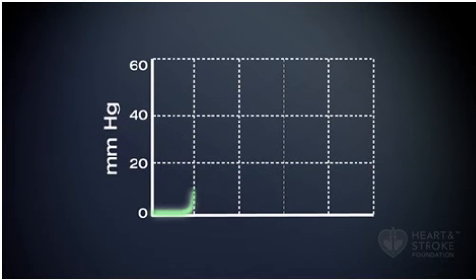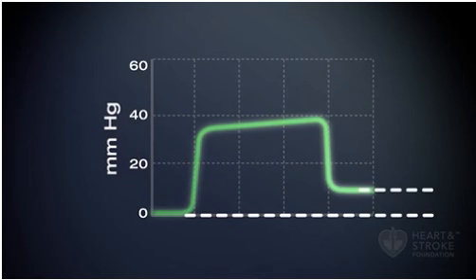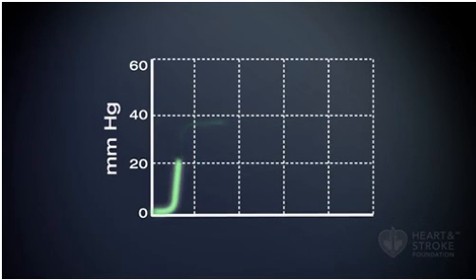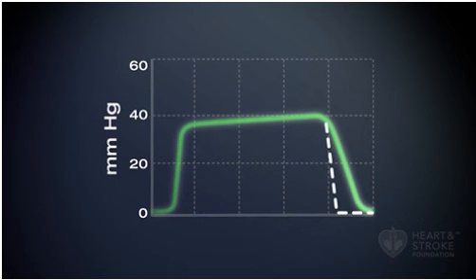A rising baseline in the end-tidal CO2 waveform suggests that carbon dioxide is re-entering the side stream sampler during the inspiratory phase of ventilation. This reading might indicate that the patient is rebreathing carbon dioxide. This waveform has a prolonged phase 4, or inhalation, section. This suggests that there's air entering the trachea beyond the entryway that's being monitored. This happens if the cuff on the tube is deflated or if the tube is too small for the patient.